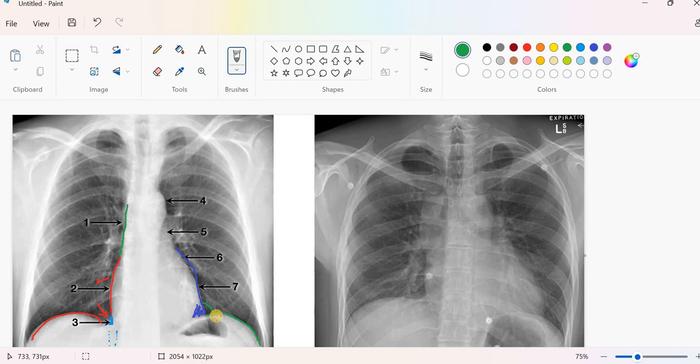This is normal. If we find it in certain cases, like we are going to explain later on, acute or right angle, that means there is abnormality in the heart and there is right ventricular enlargement, which affects this obtuse angle and converts it into a right or acute angle. So this angle is called the left cardiophrenic angle, which is between the left border of the heart, mainly made by the left ventricle, with the left copula of the diaphragm, and it is normally obtuse.